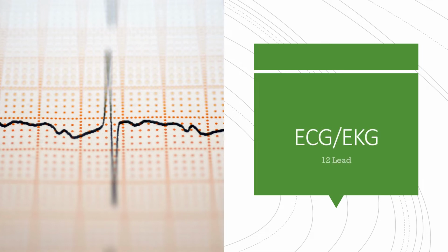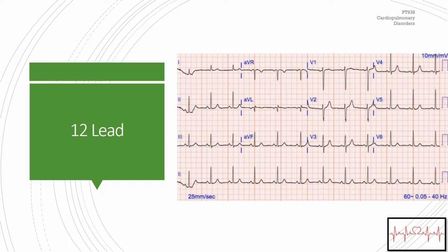This lecture will cover a brief look at 12 lead EKG. Next time we come together, come with your questions and we can go over anything that is not clear as mud on that day. I want to start just by showing you what a 12 lead tracing looks like on an EKG paper that you might see.